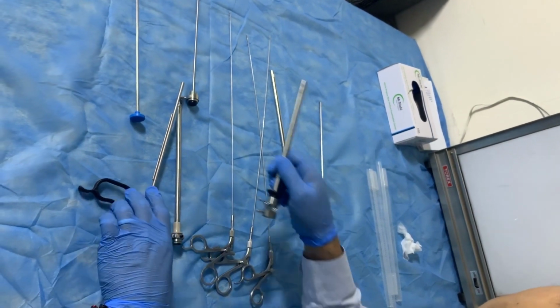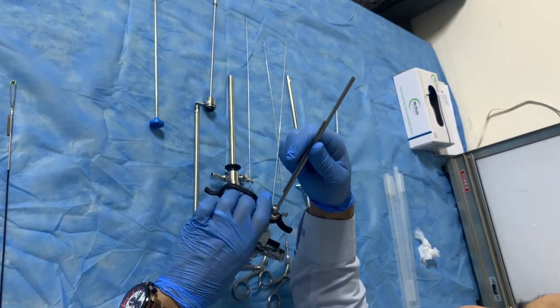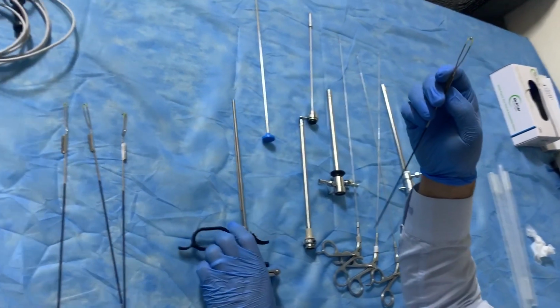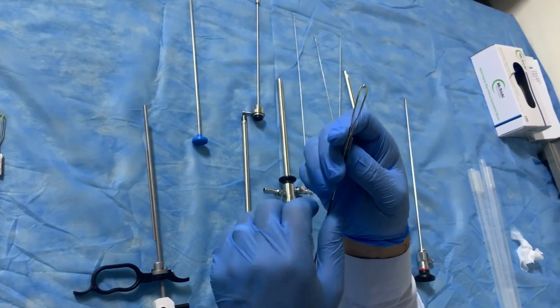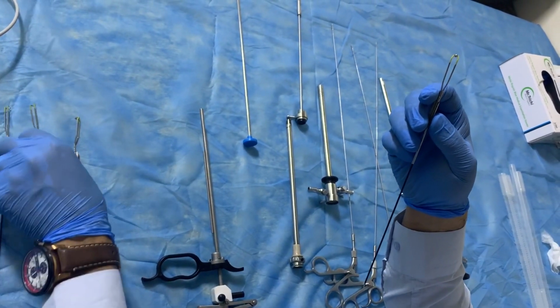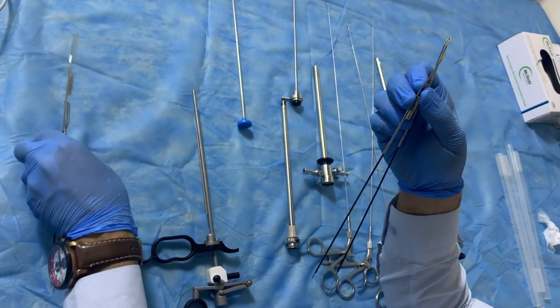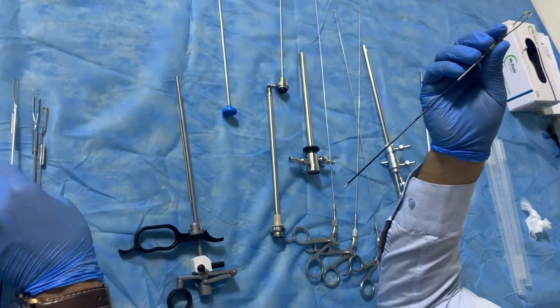Okay? So when we want to do some procedure, we use this working machine and this electrode. Electrodes many type. This rolling. This is U-shape for do some procedure inside the uterus, and another two type. Each one has its functioning. Suppose I want to use this rolling.